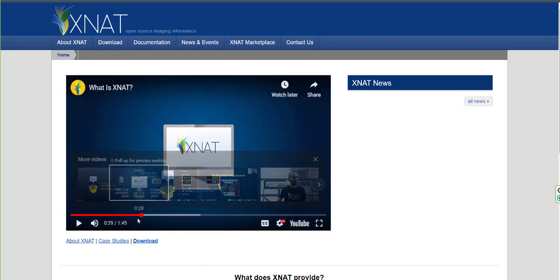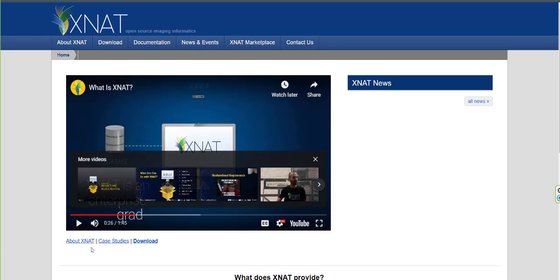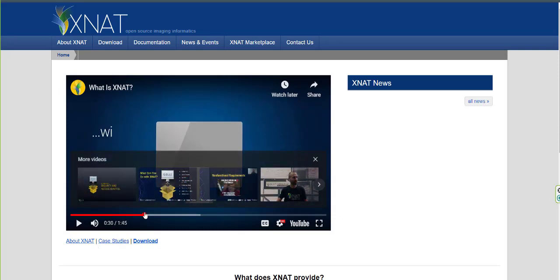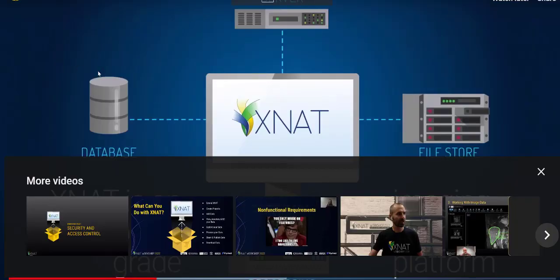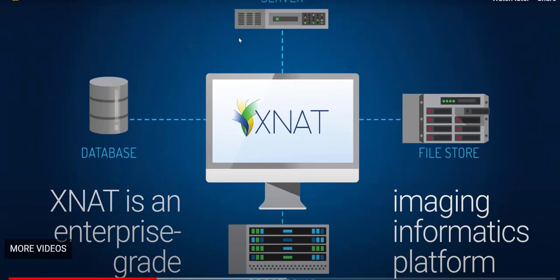So yeah, as you can see, XNAT usually is placed somewhere on the internet. There is some database that you need to put on your XNAT website, and it uses a web server for that, and there is some processing, for example, when you want to see or visualize some of these images.